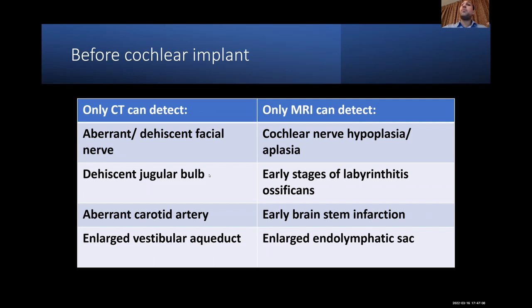Kindly consider these points. You will not be requested, even in your clinical or practical life, it is very rare to be sent any patient for pre-cochlear implant assessment, because this is sent to a specialized center, okay? But consider this point, because if anybody asks you to review a case for him, you have the points which you should comment on, okay?